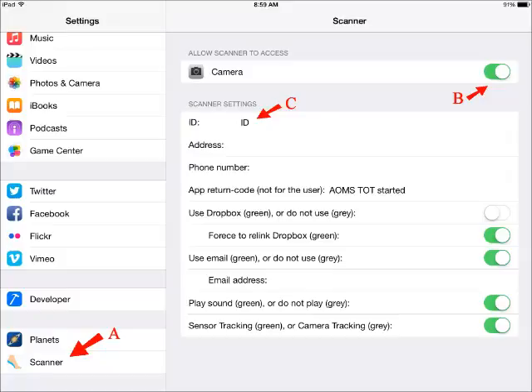Since you are ordering orthotics from a lab, they need to know who you are. You can use an ID to identify yourself. It is between you and the lab what the ID should be. It can be an abbreviation of your business name or a simple number. You cannot leave this line blank. For testing purpose, you can just leave ID in there and the app still works.